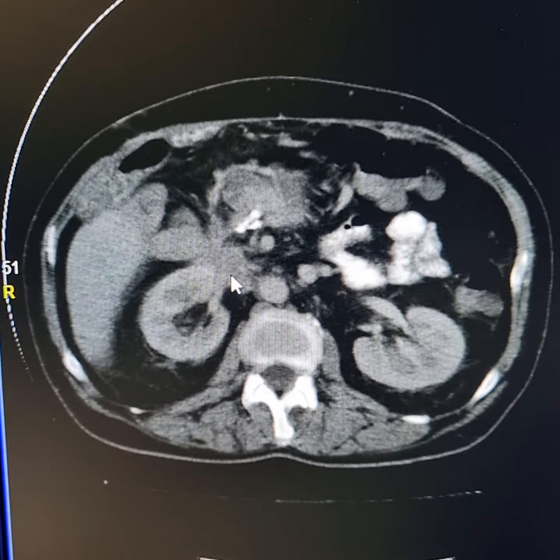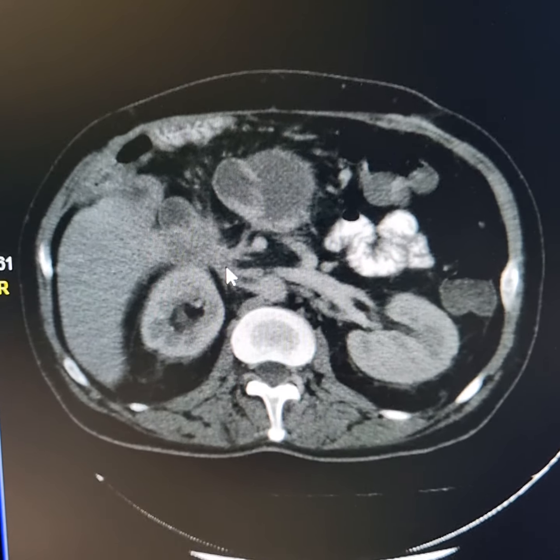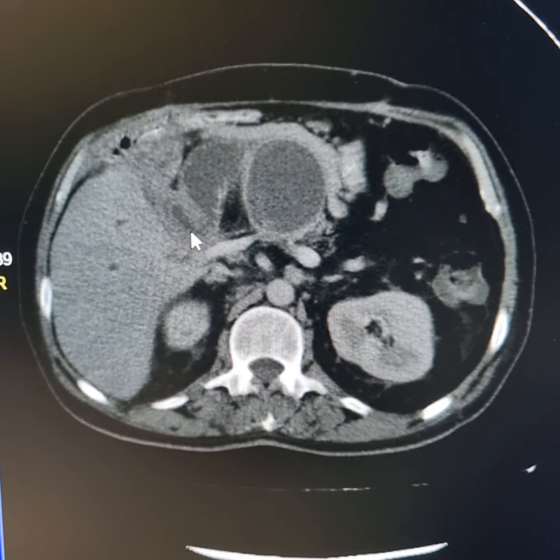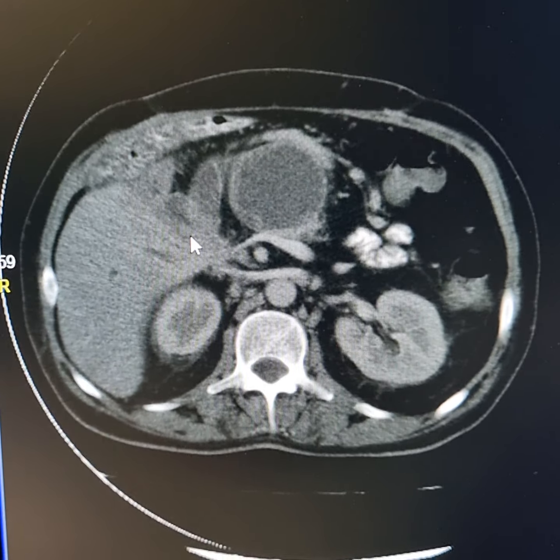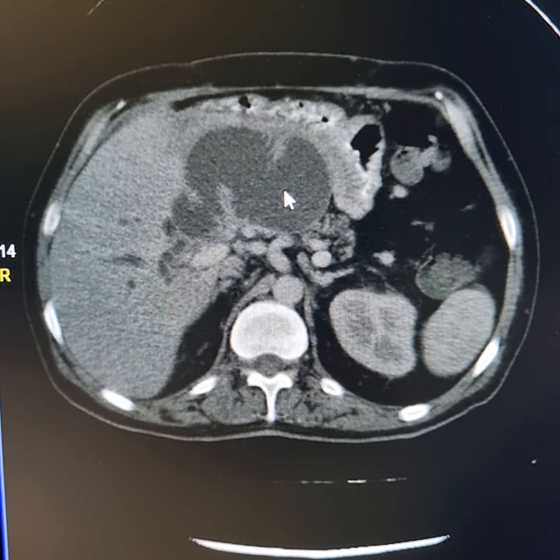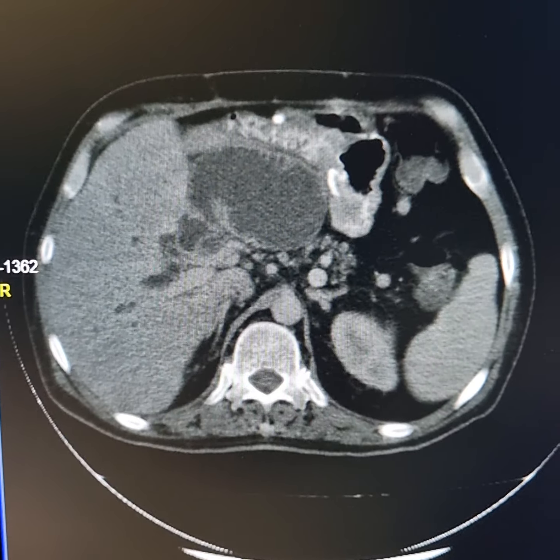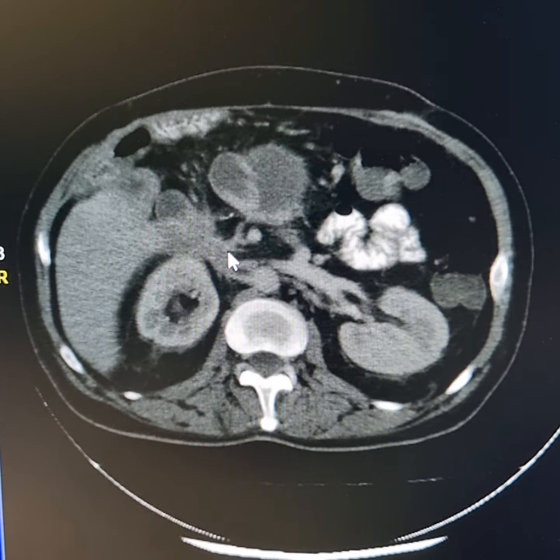So this is the metastatic mass lesion which has involved the afferent limb of jejunum here, and this has resulted in the dilatation of the small gut segment, which is ending blindly at this level, posterior to the remaining part of the stomach. Now I trace it down again.